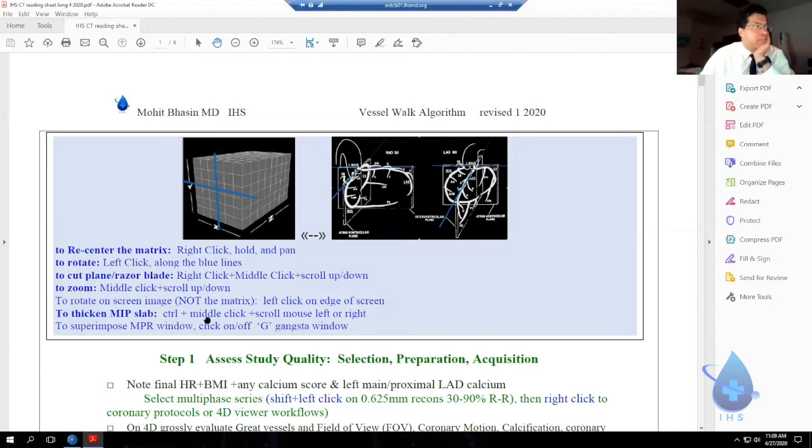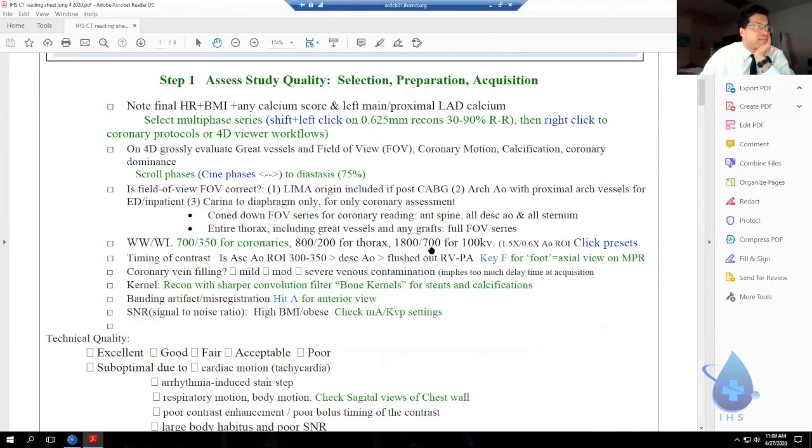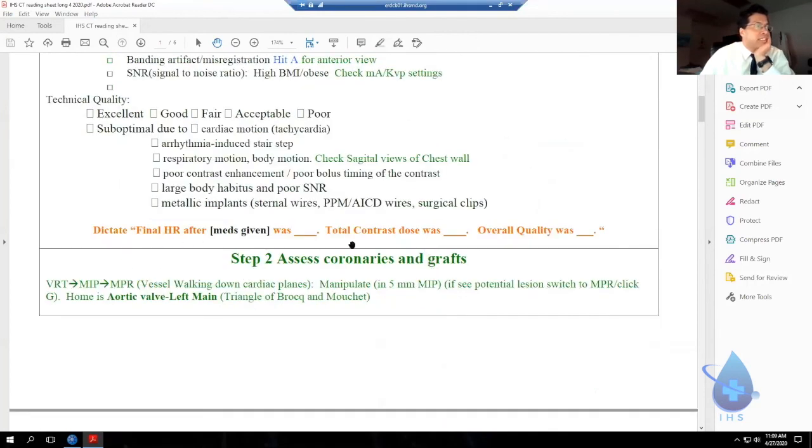Everything in green is my voice telling you what to think next or do next. Everything in red is something that you speak into a microphone when you are dictating, okay? I went through every cognitive granular step so that it's all labeled and color coded.